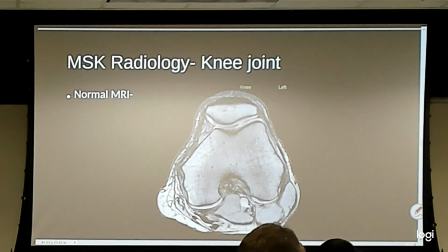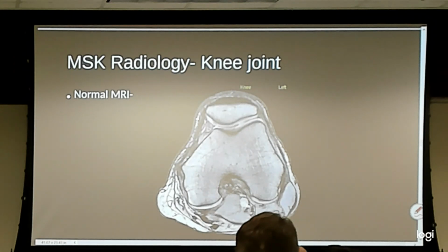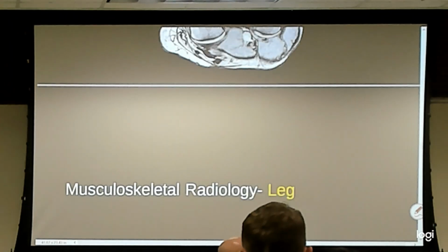We do have an axial cut that can look, again, at that same view. We were looking at the sunrise view. We're looking at the cartilage surfaces on the front of the femur and the back of the patella, looking for potholes and similar things that would be painful or uncomfortable or catching symptoms from when a patient flexes and extends their knee. It's where the patella is forced into the trochlea, and if there are potholes in this area, that would cause the patient's symptoms.